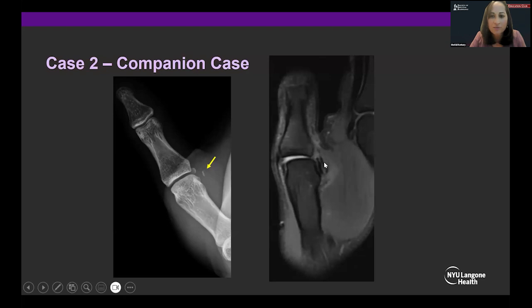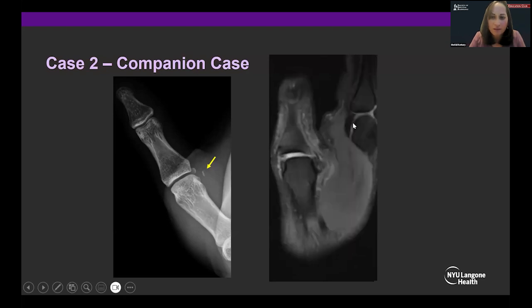We're starting to see this low signal intensity structure. And right here, we see the low signal intensity adductor pollicis aponeurosis sitting with the retracted ulnar collateral ligament here proximally. So this is that yo-yo sign that some of you indicated, indicative of a Stener lesion.